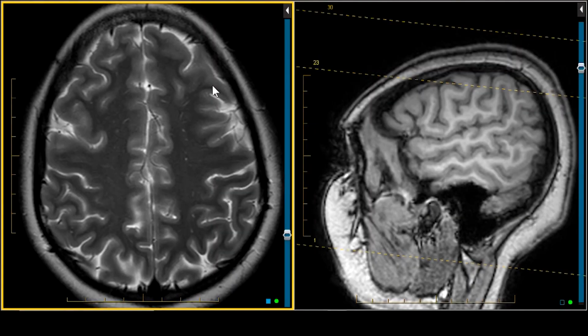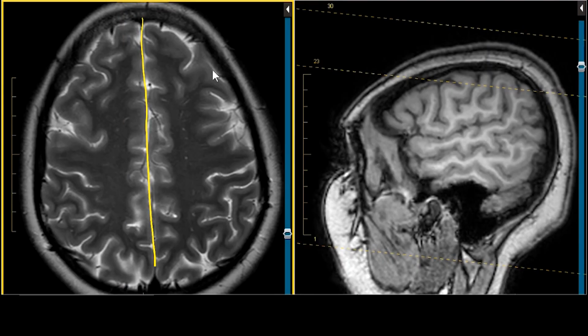Let's successfully isolate in the axial projection the central sulcus of Rolando. Let's start out by turning the brain into a little bit of a map. We're going to bifurcate the brain right down the center along the falx, and we'll call this 12 o'clock. We'll call this 6 o'clock. And then at the level of the widest biparietal diameter, we'll have 9 o'clock and 3 o'clock. So now let's keep that in our mind's eye. We've got a sulcus right here, which represents the superior frontal sulcus.